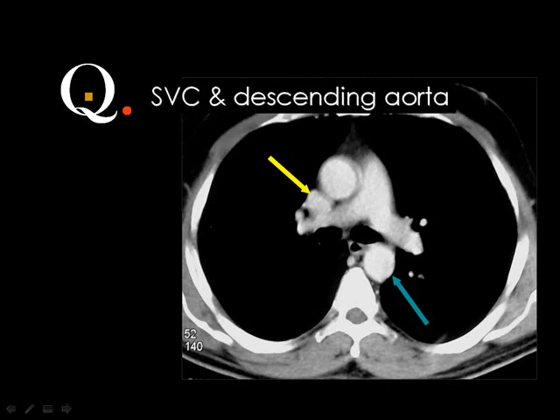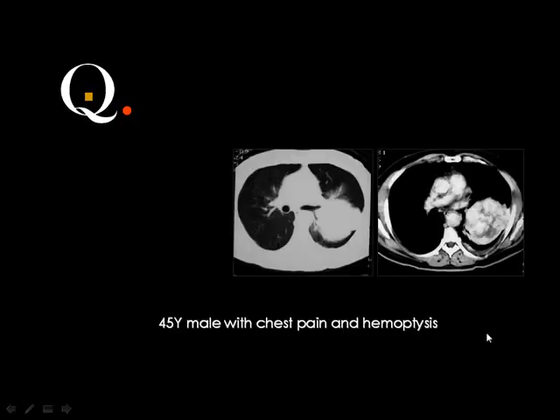Very good. What do you think the site of this bronchogenic carcinoma is? The trachea is bifurcated here, and then this is the upper lobe, and this is the lower lobe. This is the left lower lobe. Whenever the trachea divides, the section is divided.